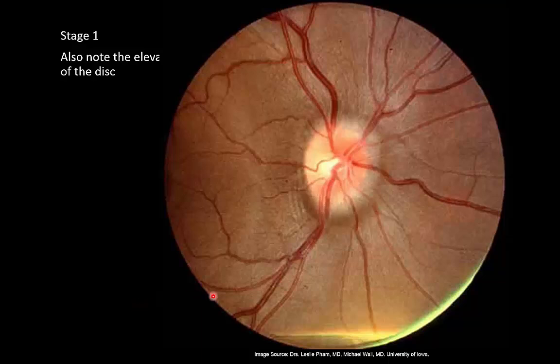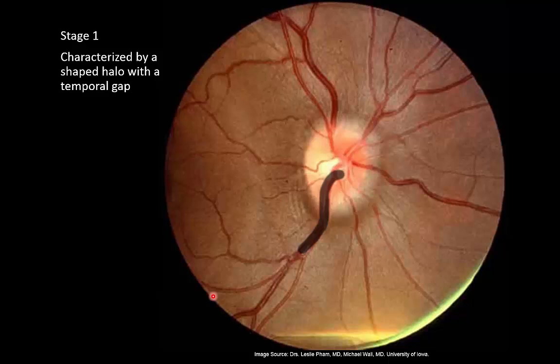So let's do an example of this. Right here, look at the blood vessel here as it runs down. The one next door, same story, comes up, goes down, then it's straight. Over here, comes over, down the hill, then it's straight. Over here, comes down, then it's straight. So the disc head here is elevated. So the blurring and the elevation of the disc really marks this as papilledema. This is an early stage.